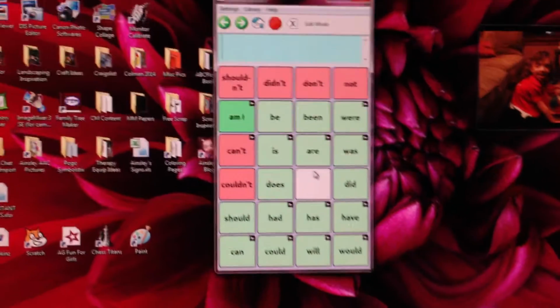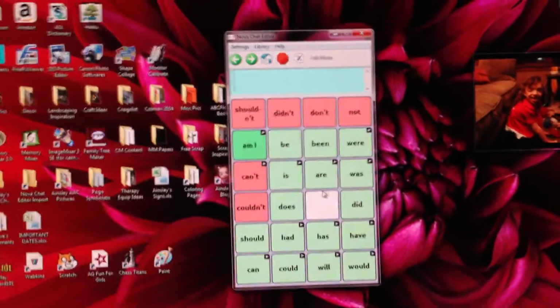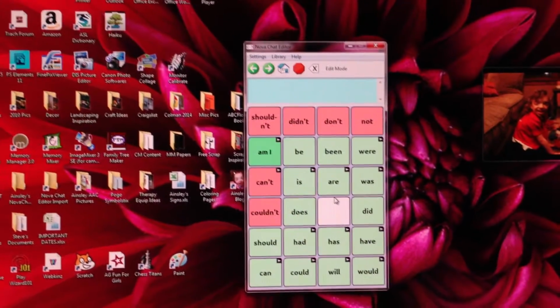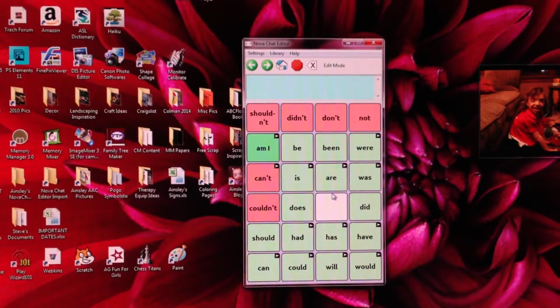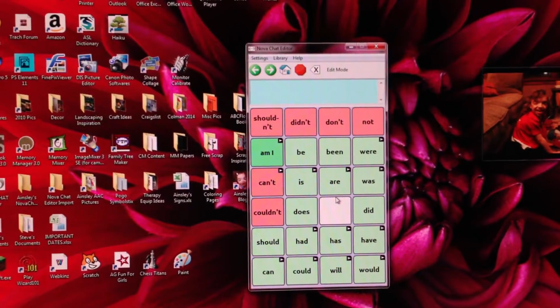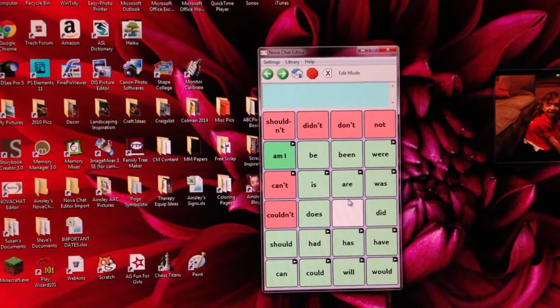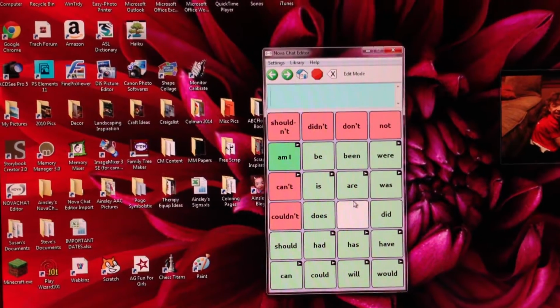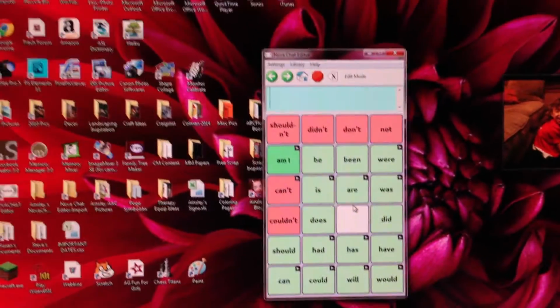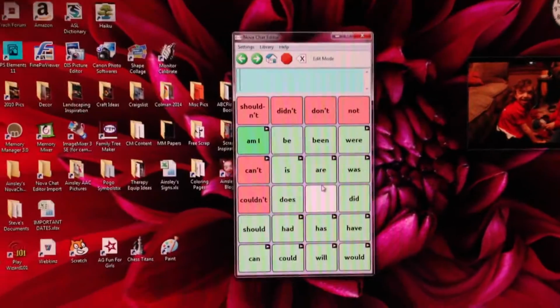So you see that not having a home button can be problematic. If you are an experienced user and you've already memorized all the locations, you're not going to make so many errors of going to the wrong place because you're going to know where things are. But there are times that you navigate to a page and you get stuck because the word that you want wasn't ever on that page, but you had to get to that page in order to say the word in your sentence that you needed. So a home button is really kind of critical.